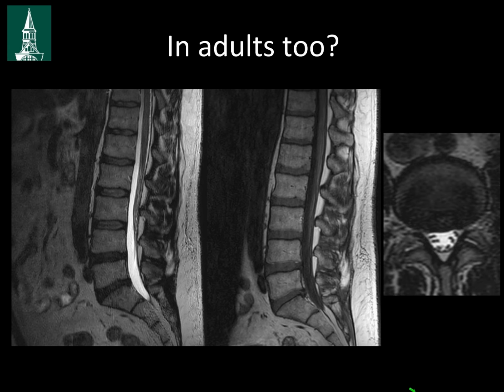So with the 3Ds, because these are isotropically acquired, we can reconstruct these in any plane relative to the disc. So if we just do a straight axial reconstruction, this patient has a pretty straight spine, but in patients who have an exaggerated lordosis, we can actually reconstruct them in planes parallel to the disc space, and that is helpful for using the MPR tools that are available. Or certainly we can even do obliques in the cervical spine.